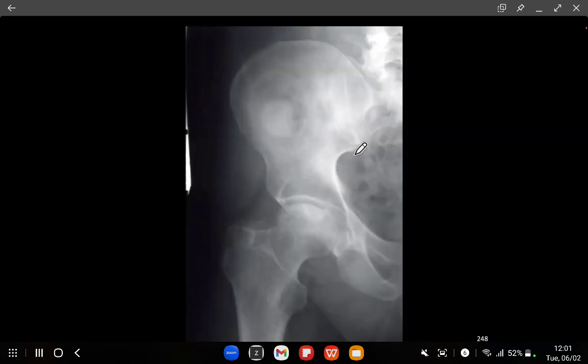Okay, while we're on the subject of avascular necrosis of the hip, there's another example of AVN with flattening of the femoral head there, and this is an ileostomy bag. So the patient has been on steroids for ulcerative colitis, and they developed AVN of the right femoral head.